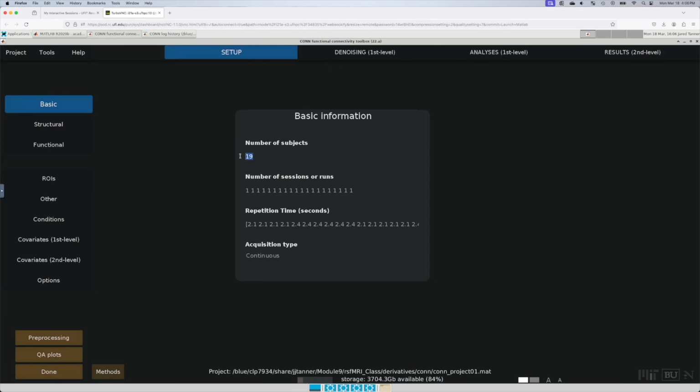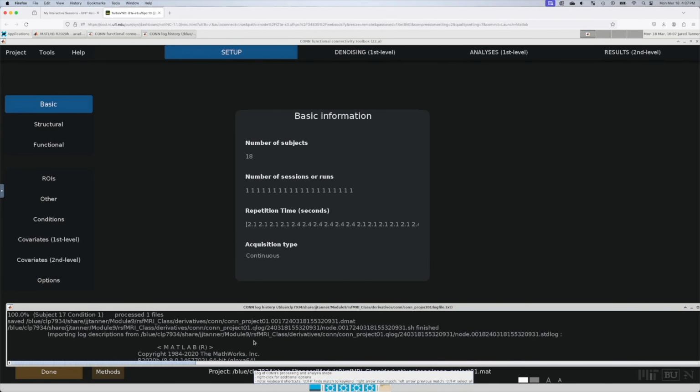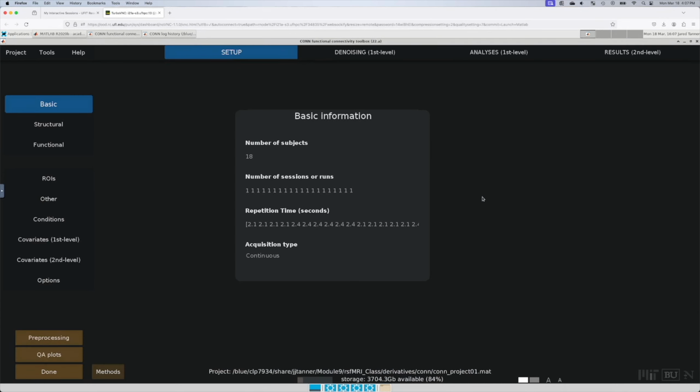So now I'm going to go back, let's change it. Let's now do 18. And I think it was still thinking, it has to do a little bit of setup.